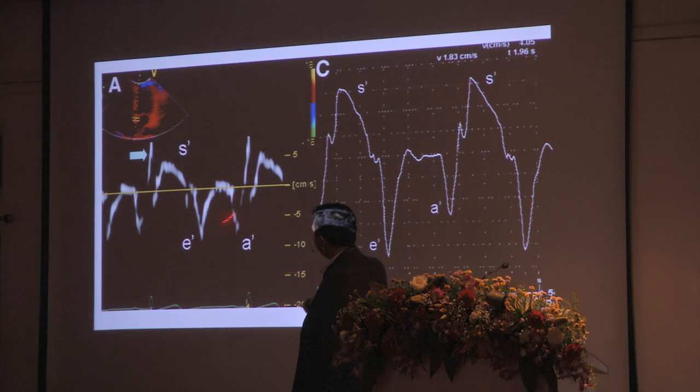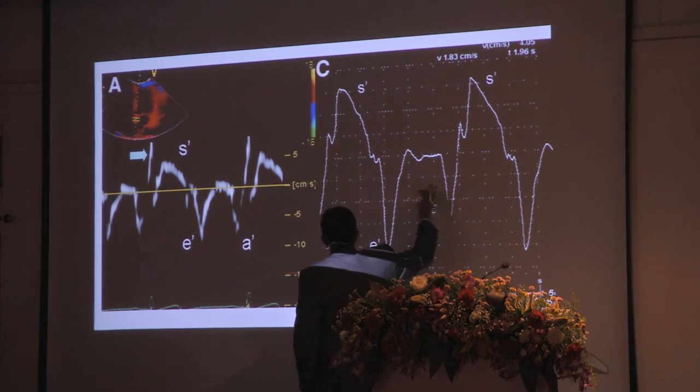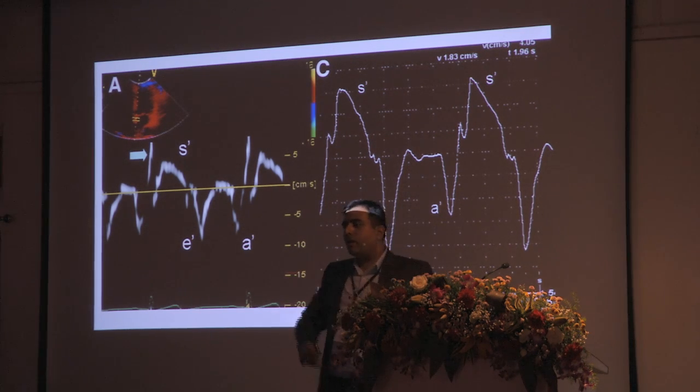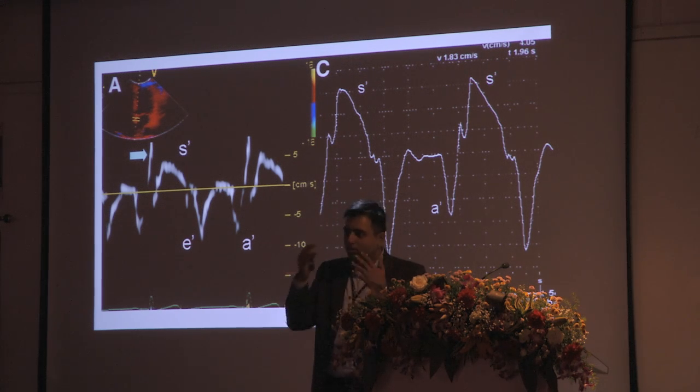Now, this is what we are used to. And this is what I want you to get used to now. This is the output we get from parametric imaging. It is our job to be able to decipher all these different curves and make sense of them. You may not need to use these in the future at all, because things are becoming more automated. But it is important to know. Knowing what you are seeing and knowing what you're doing is, as Baba said, one of the most important things to do. Doing things without knowing is the most dangerous.